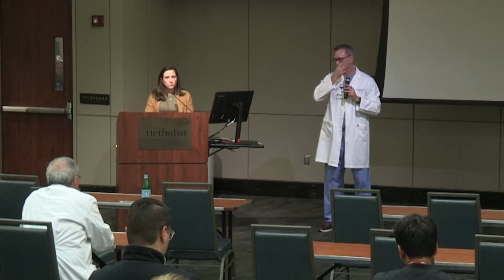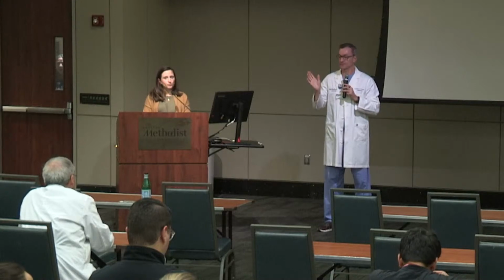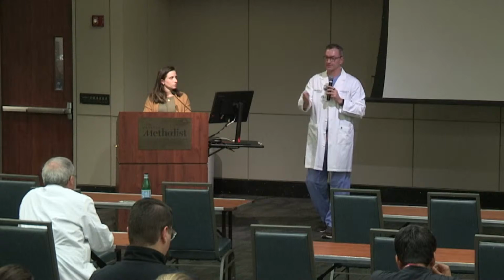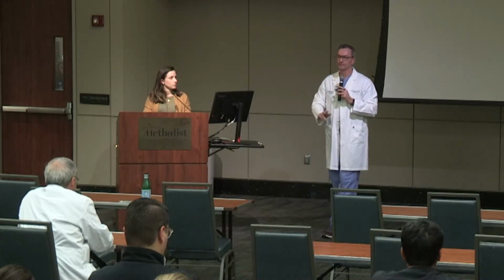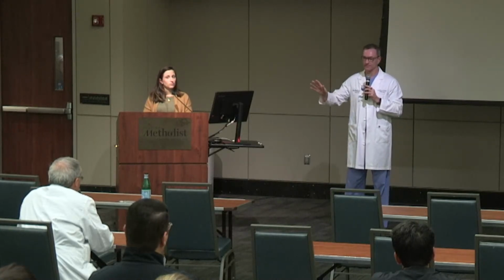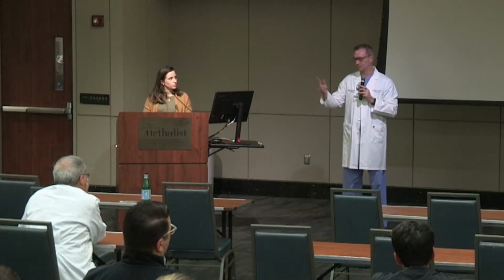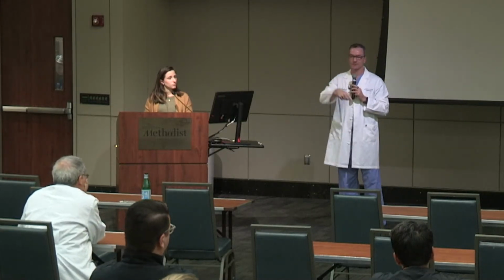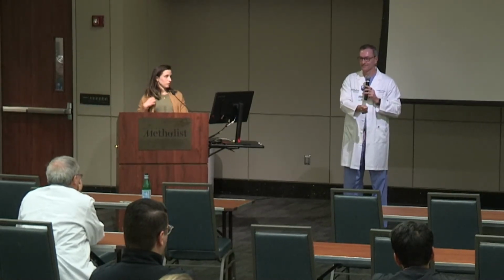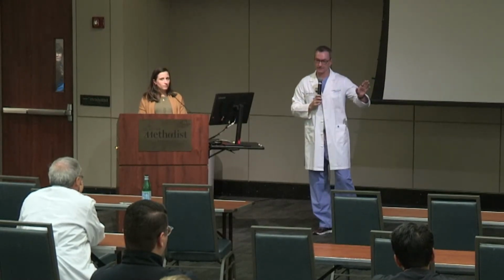The history is interesting. We started doing this therapy with drive-by mitral clips. The way the finances worked, Abbott is incredibly smart with this. The bill is for the catheter, not the clips. Always has been. So if you do 1 clip or 4 clips in the mitral space, it's the same bill. They just want to get outcome. So you pay for the catheter. And the idea is, once you've done that on a mitral case, put 1 clip, 2 clips, 3 clips, whatever, if the patient had significant TR, you would do it on the way out, because you've already paid for the catheter. Clips are free. Drop a clip on the tricuspid. That's how we and a lot of centers learned how to do this in the early days.